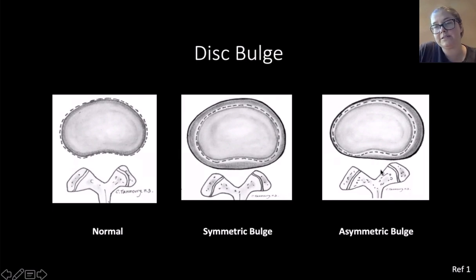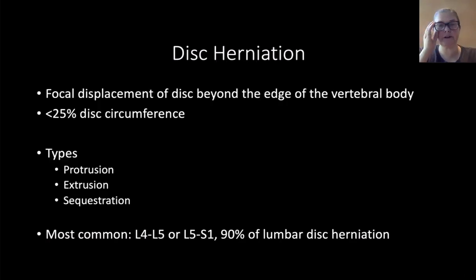Asymmetric disc bulge is exactly that. It's asymmetric. And I think it's a good idea, like you want to say disc bulge or asymmetric disc bulge larger from central to left extraforaminal locations to describe where it's asymmetric, or asymmetric disc bulge larger on the left, something like that. So disc herniation, it's acceptable to say in your report a disc herniation.